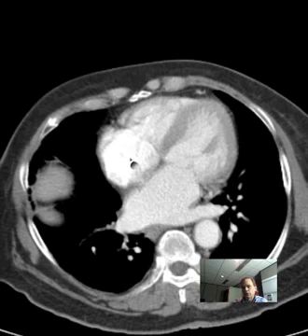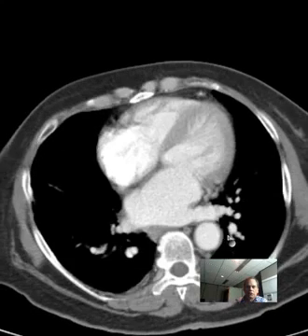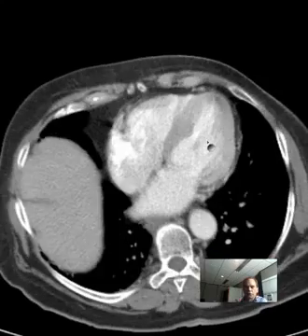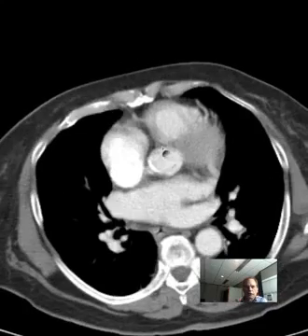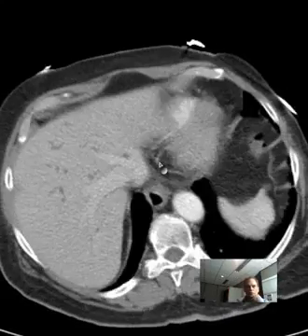If you're looking at the atria and you're not sure which is which, you'll see that the left atrium is going to be receiving oxygenated blood from the lungs, and so you will see pulmonary veins coming in from the lungs to the left atrium, which then goes to the left ventricle, which subsequently goes out the aorta, of course, to the entire systemic distribution.